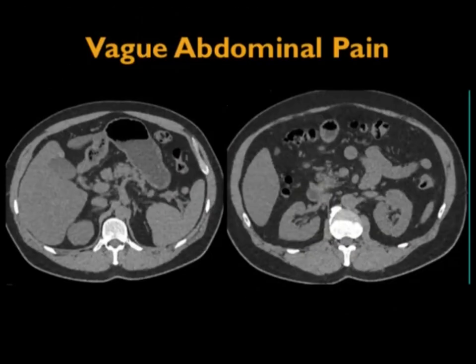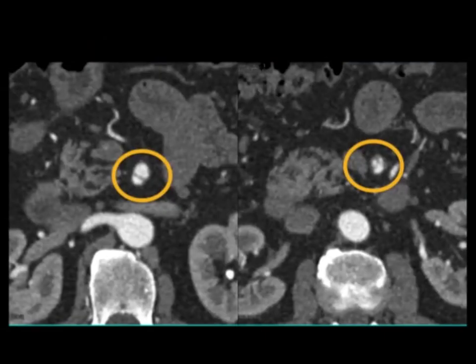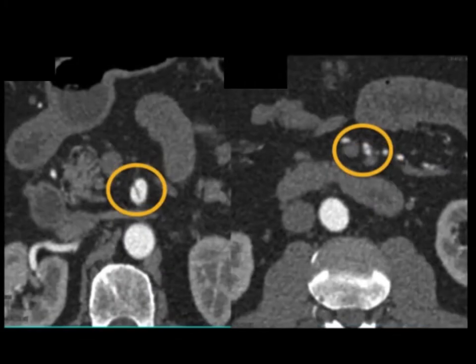Another patient, abdominal pain. Here we did the non-contrast. The original thought was renal disease. Well, now you look at the patient's celiac here. It looks enlarged. And when you watch it more carefully, look at the dissection in the vessel. And when you follow it down, there's dissection.